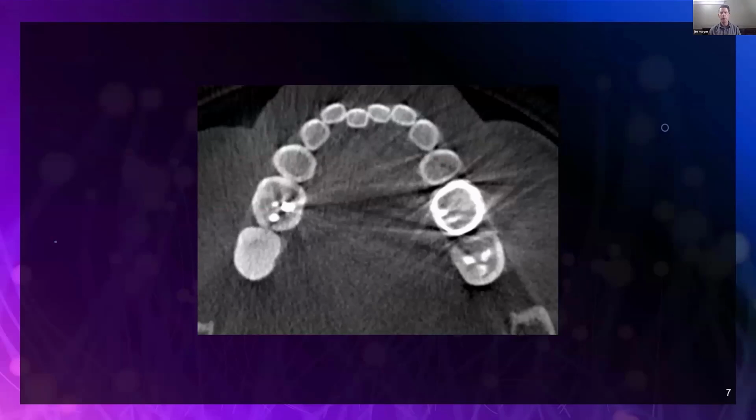So this is another touching point on patient positioning, where we want to make sure the patient is positioned in a flat occlusion to have that streaking effect go horizontally, so it's not interfering with other parts of the data set itself. I think we're going to look at some more of that. The next thing we're going to be looking at pretty soon is maybe moving into that patient motion too.